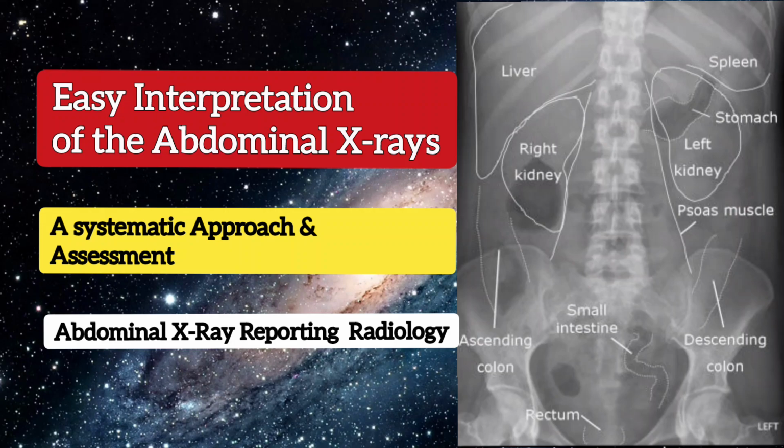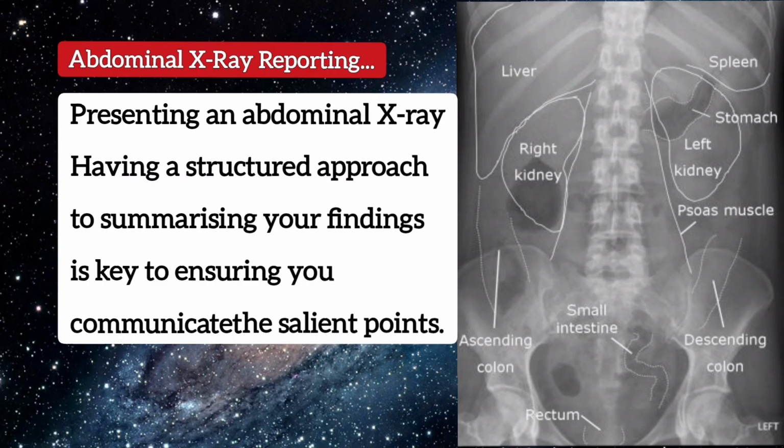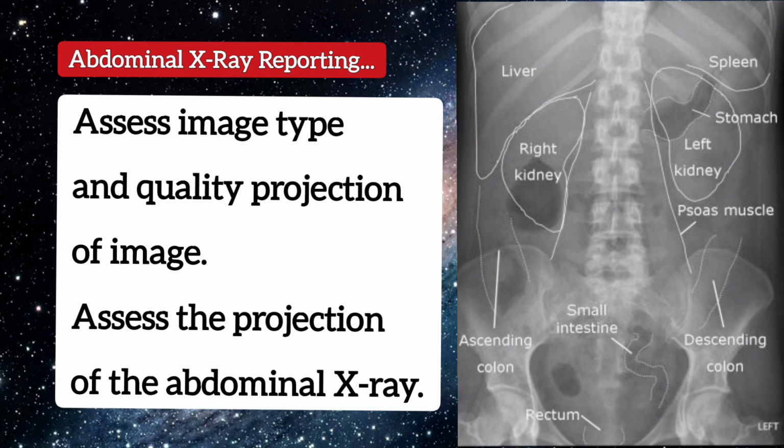A systematic approach to the interpretation of abdominal X-rays. Presenting an abdominal X-ray. Having a structured approach to summarizing your findings is key to ensuring you communicate the salient points. Assess image type and quality.